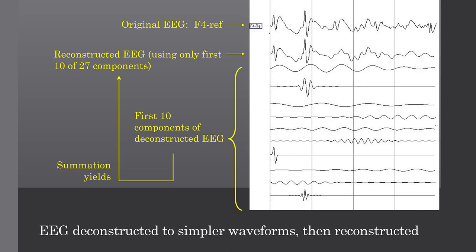Now the other thing, of course, is you can take these sine waves and put them back together and reconstruct the original signal. The fidelity with which that's done really depends on the FFT parameters. That's not something that you do clinically, but it's just something to know that those sine waves actually can be recombined to recreate the original signal.